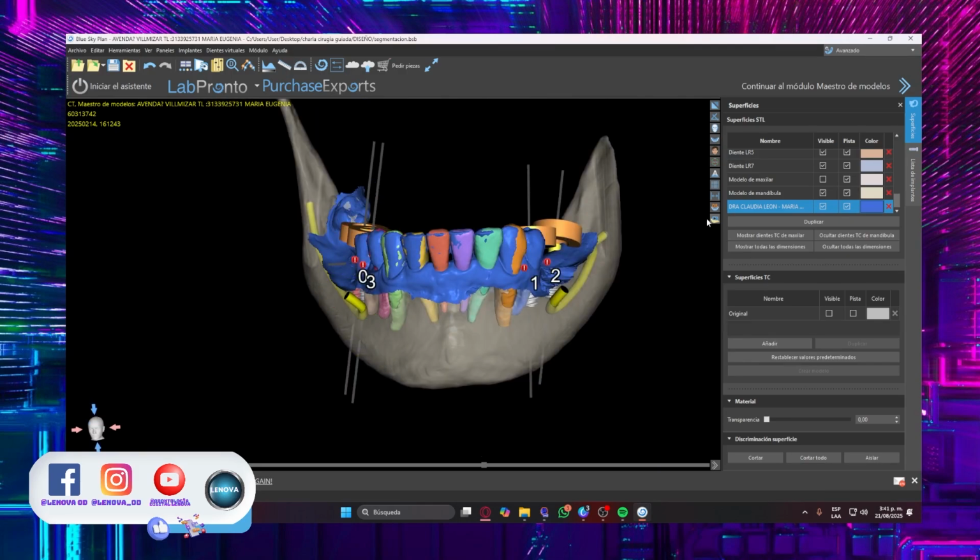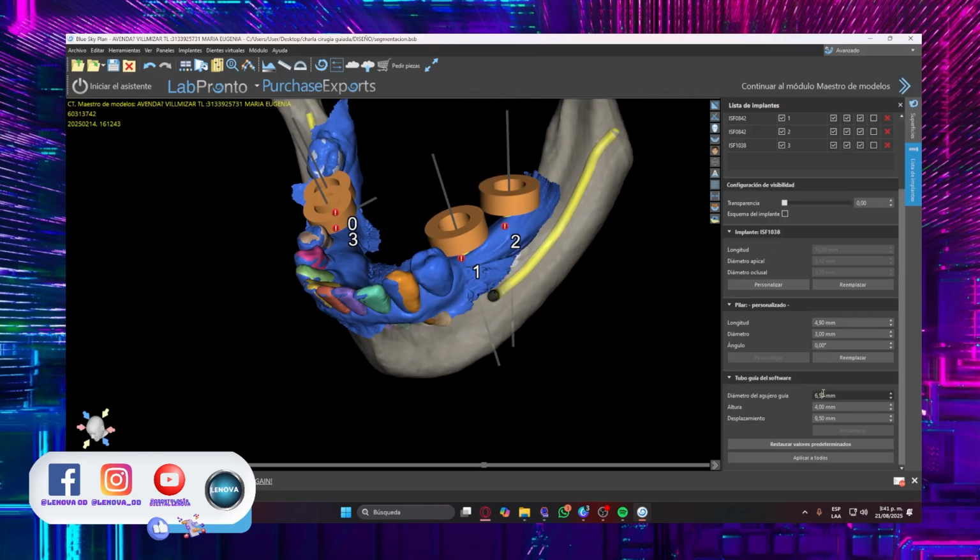So what am I going to do next? In this case, for DIN, the external diameter of the DIN drums is 6.5 and the height is 4. I do not recommend leaving that height at 4, leave it at 6. Keep one thing in mind. If the drum is as tall as the ring, when I do the Boolean, the soft tissue will remove part of the drum, and when the ring enters, the soft tissue will expel it because there is nothing to cover it. Yes, that is a very big problem.